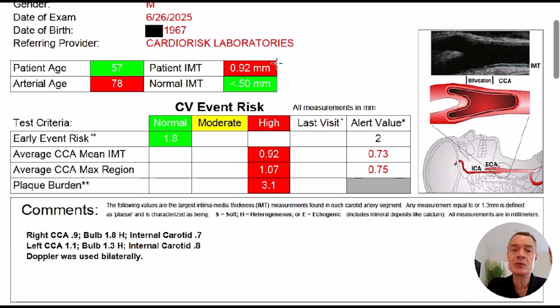So think about this logically. In order to assess, hey, if I get this number down, which is unusual to start with, I'm going to need to get it down by more than a certain number of standard deviations, because there's going to be measurement noise on the next scan in addition to this one. So think of it this way.